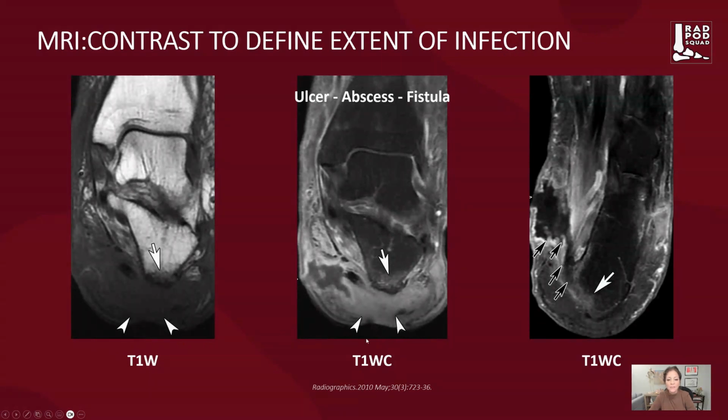And what we're seeing in this region is that on post-contrast imaging, we have a lot more going on here than meets the eye. And in fact, this is a rim-enhancing soft tissue abscess contiguous with the ulcer. And here we can see on that transaxial image how that large abscess is draining right out through the ulcer. And of course, we can see this enhancement of the calcaneus in this area that we had the suspicion of T1 change in a patient with osteomyelitis and abscess.